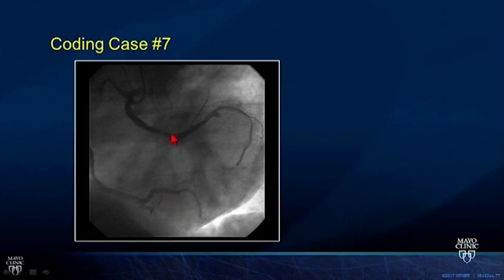Then you see this other vessel, though, also coming off right where the right coronary is. So that's a sign of a coronary anomaly. And it does have a pretty long branchless origin as well, which is a sign of an anomalous circumflex. The other big thing here, which is very tricky, and you probably won't get this on the boards, is that there's also a stump here off of the circumflex.